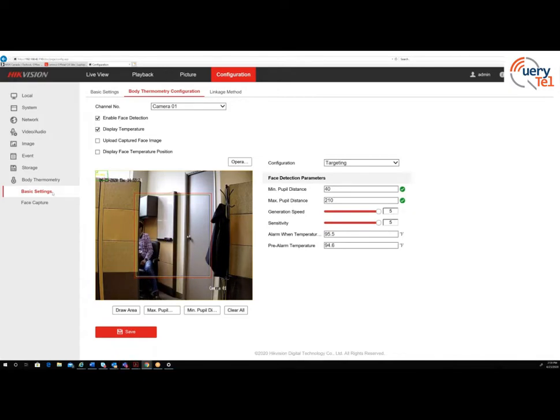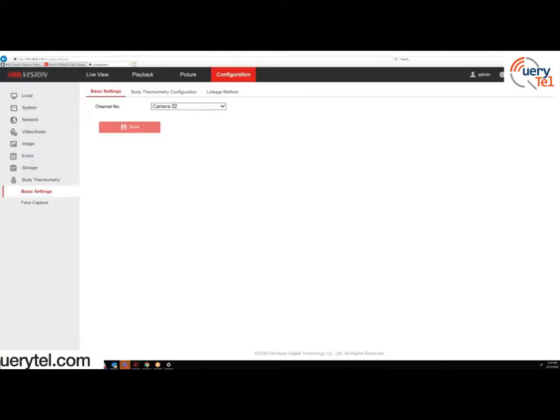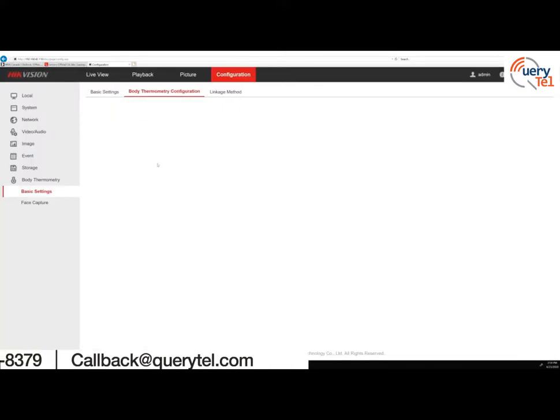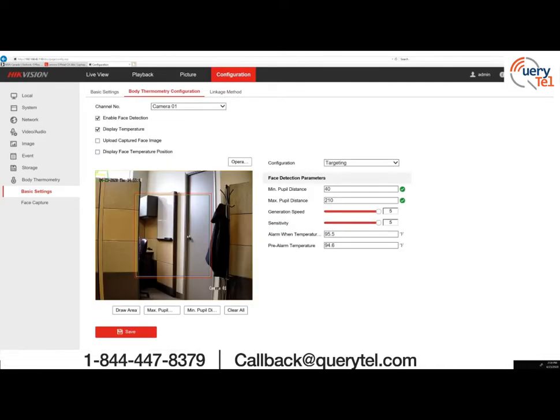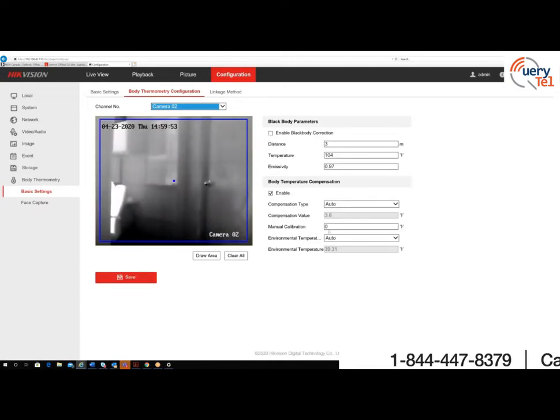So 96.8. So we have to do calibration. So pre-alarm. I'm going to go here. I'm going to do -1.